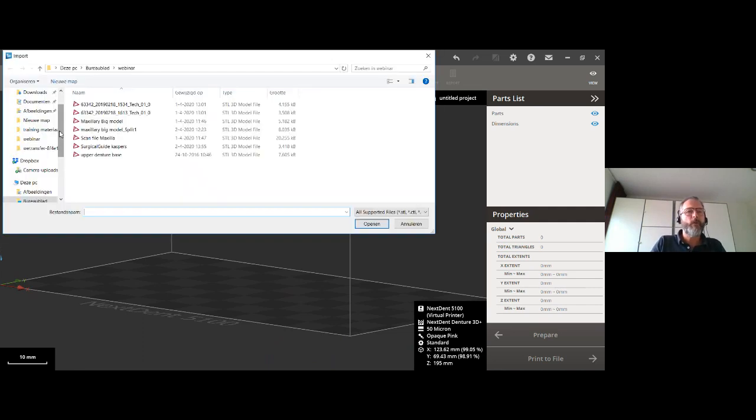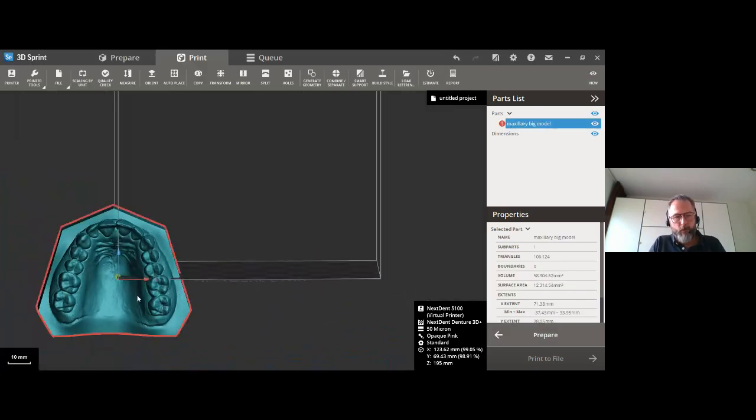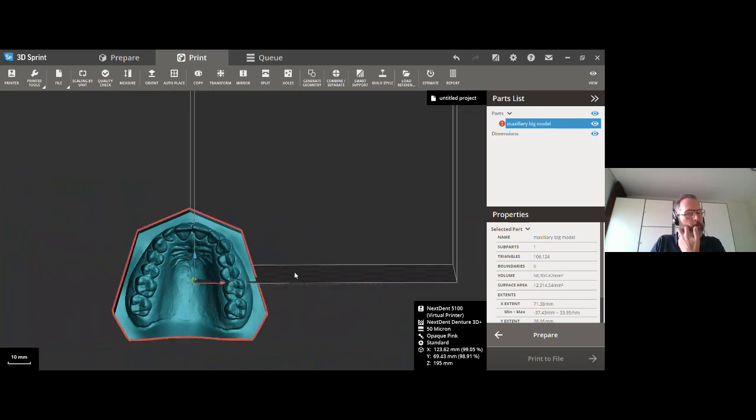Good question. Let me take the model that we've used. That the models are not inside the platform is actually almost always the case, and we are going to hopefully change this. In order to do so, we need some information in the STL files.